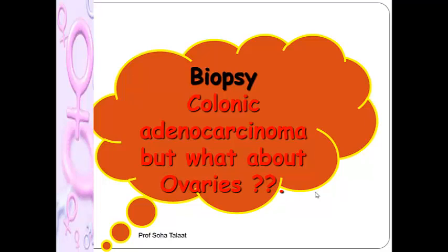You have to look for all organs present in the pelvis, not only the uterus and ovaries. You have the urinary bladder, you have the rectum, you have the peritoneum, you have many of the anatomical locations that can give pathology. So what about the ovaries?